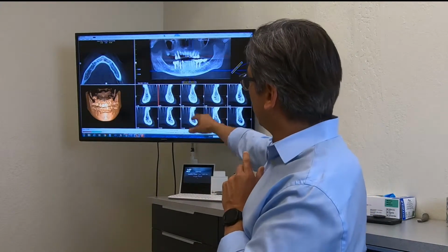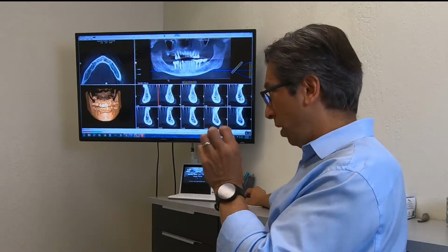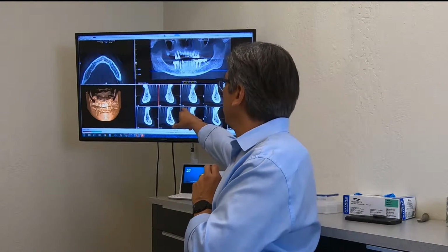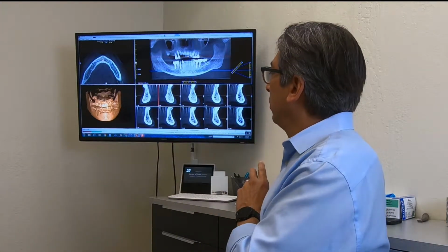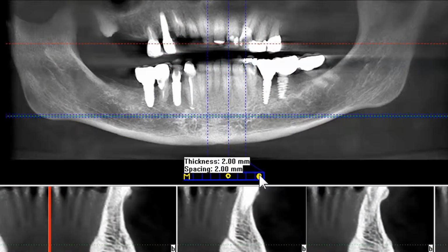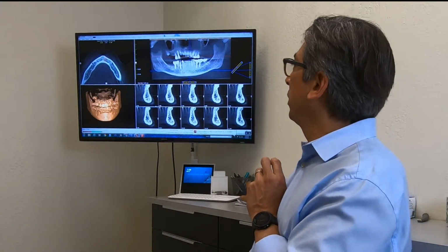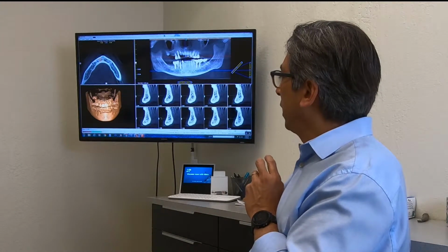These auxiliary slices are 2 millimeters away from each other, and from our middle line here. If we want to bring it down to a millimeter, you can grab this little icon here and move it forward. So we go to 1 millimeter. I typically like to see 0.5 millimeter. So now each slice view is about 0.5 millimeter, according to when we move the middle bar here. And you can see how it just changes.